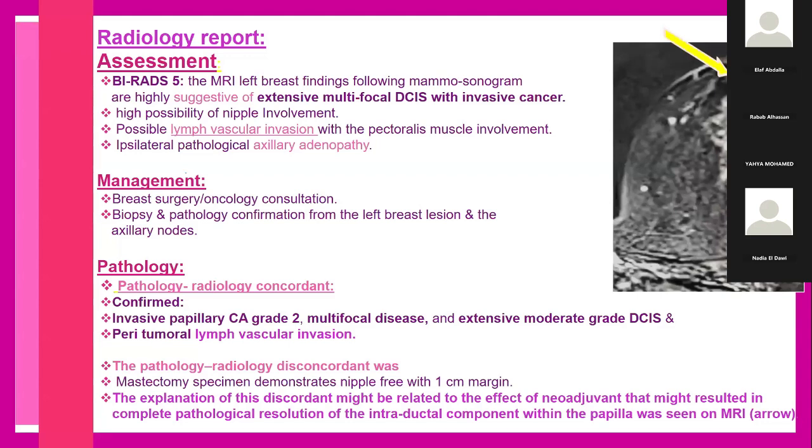So the pathology report was concordant with the radiology report, confirming that this lesion was grade 2 invasive papillary cancer. It confirmed that it was multifocal as radiologically reported, with extensive moderate DCIS.